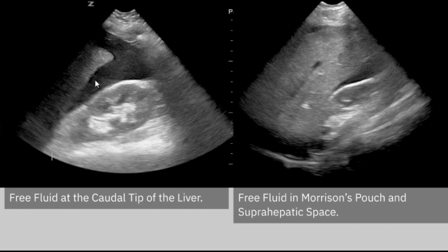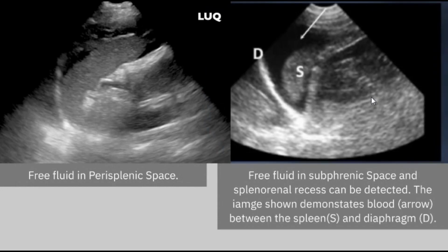So of course this implies that there is indeed... if you see that, there's indication for CT scan. Yes, or there's a liver injury. Just go for CT. Again, this is a free fluid between the liver and the kidney. This will denote that there is underlying liver damage.